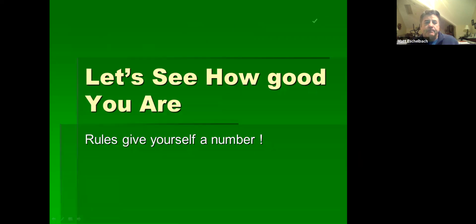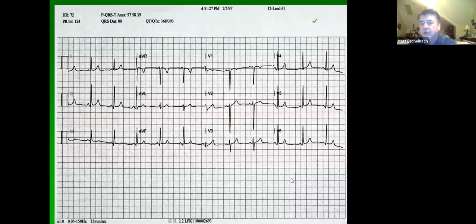All right, so let's see how good you are about talking about STEMIs. We're going to talk about, for the next remaining time, just STEMIs and how they change. So give yourself a number. Starting with, I guess, Wes, you'll be number 1, Keith number 2, Ray number 3. Give yourself a number and we'll go through these one at a time. All right, so Wes, unmute your microphone. Tell me what you see in this EKG.